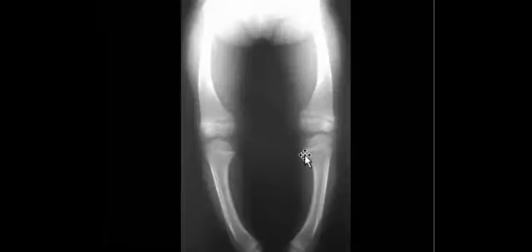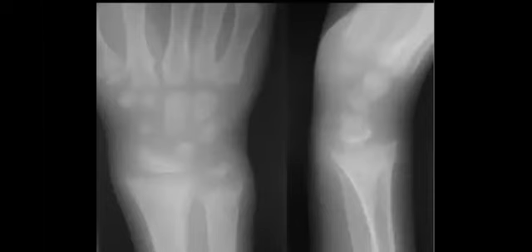And sometimes they show you this appearance, to note the bowing of the bone. Yeah, and they will ask you which stage you are talking about. Is it healing or healed or active rickets? So you should mention one of the three, either active or healing or healed. Do you think this one is active or healing, with this fraying and cupping? Active rickets. Yes. So you should mention that it is not just rickets, it is active rickets.